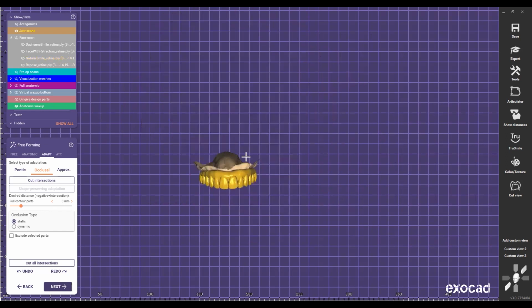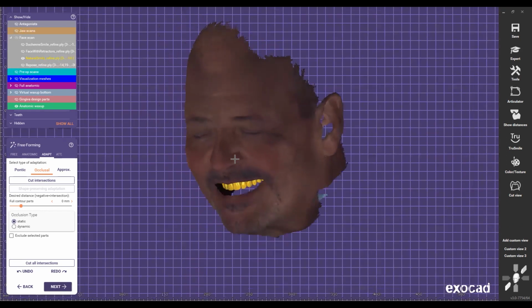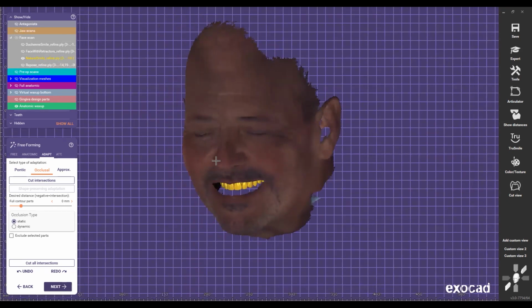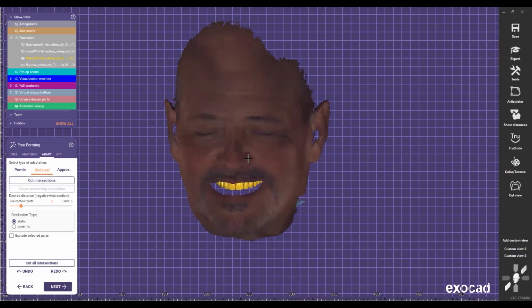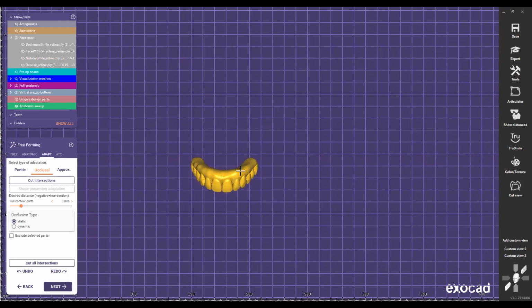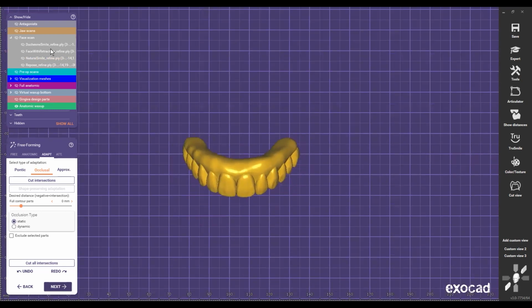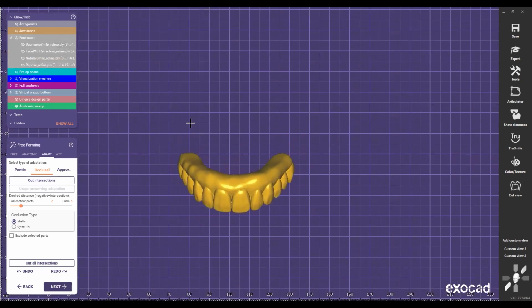That's how confident you become once you start understanding how to make these cases with the face in place. I started doing this in 2015, and since then my career changed. Exocad changed my career, so I'm very happy because of that. Plus facial scanners; not every facial scanner works the same. As you saw at the beginning, we're able to match the intraoral data with our facial scanner accurately. Plus we're able to get a bite, which is how we deliver. We nail the occlusion every time, especially for complicated cases, when the patient comes with crooked teeth, bad teeth, right?